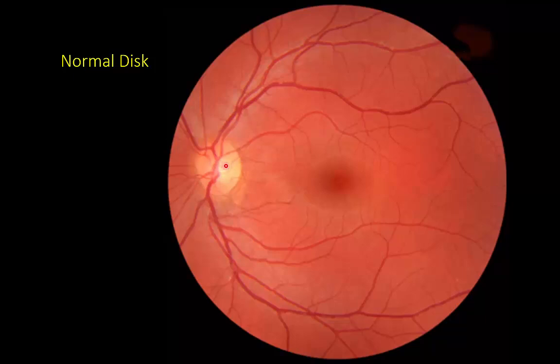If we look at the ratio of the cup to the entire disc, normal tends to be about 0.3, up to 0.5 may be considered normal. From the optic cup come the blood vessels, the arteries and the veins. You'll recall the arteries are smaller, the veins are larger, and the veins are redder because they have deoxygenated blood coming back. Then we have the retinal areas, and in the center we have our macula and the fovea, the area of central vision where most of the cones are located. So here is our normal optic disc, which we'll refer to when looking at several abnormalities.